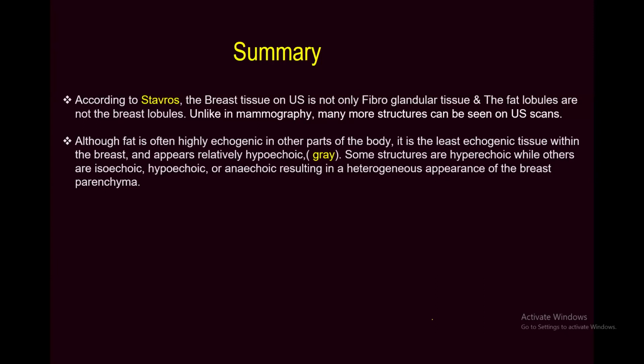We usually try to adjust it as intermediate gray, and refer other structures to its echogenicity.